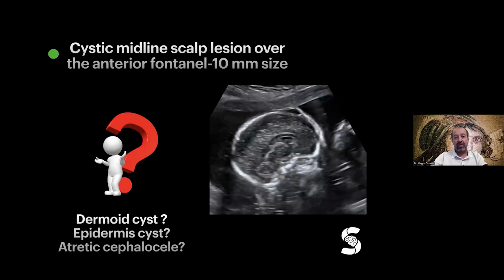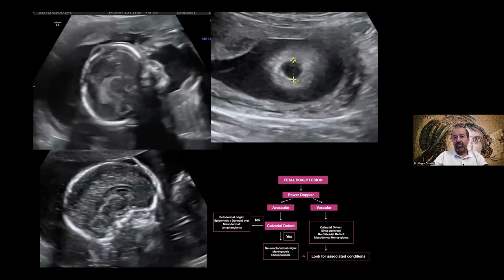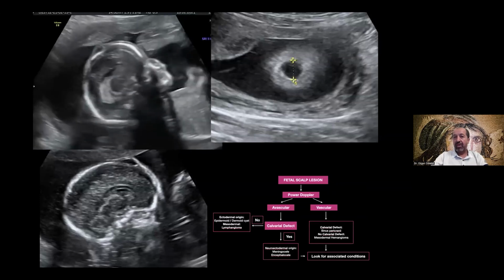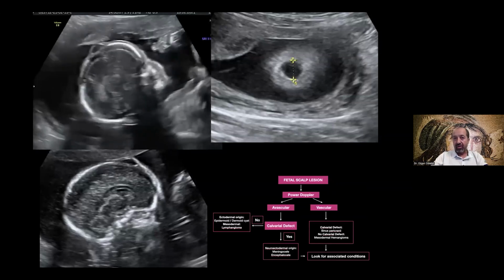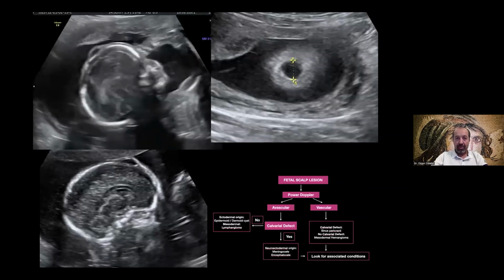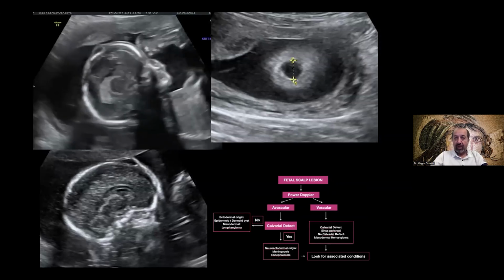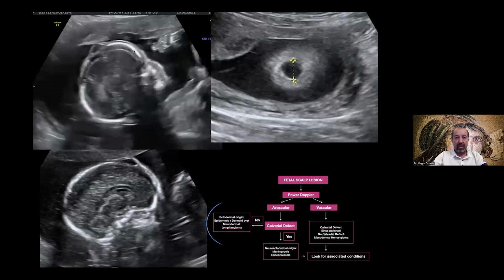Let's start with this simple case. Actually, it looks simple, but it's life-saving. Extracranial fetal masses are findings of major diagnostic alarm, of which encephalocele is the primary consideration. Doppler ultrasound revealed no solid tissue components or vascularity within this lesion. Power Doppler showed no abnormal communicating vessel beneath this lesion.